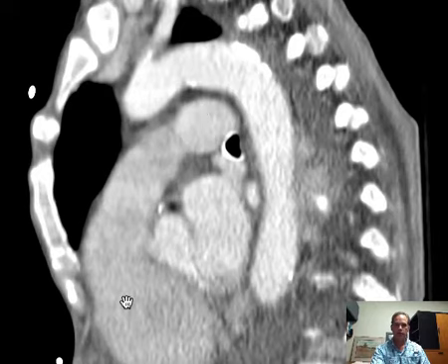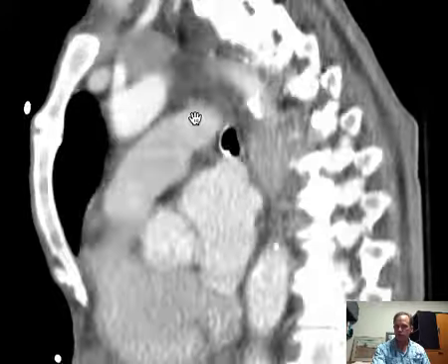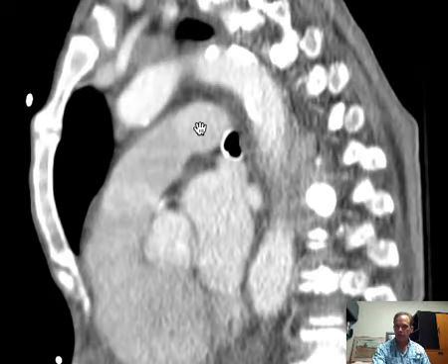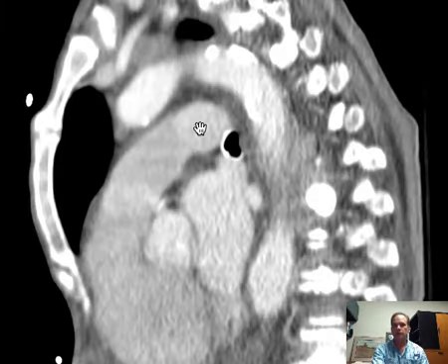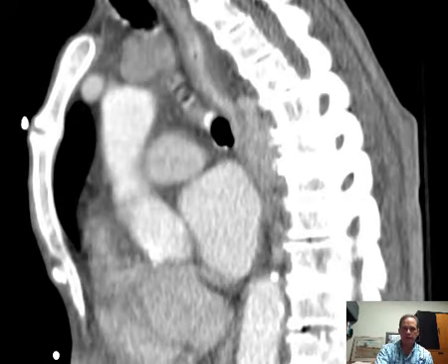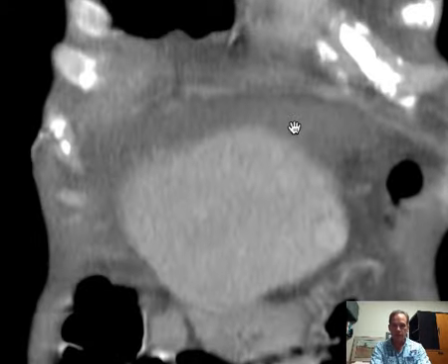The main pulmonary artery arises anteriorly, meaning very close to the sternum, from the right ventricle, and then dives back to branch inferior to the aortic arch, where it gives off the right main pulmonary artery and the left main pulmonary artery, which then, of course, branch into the two lungs. Last chance here. Let's try this in a coronal plane, and this should summarize things, I think.